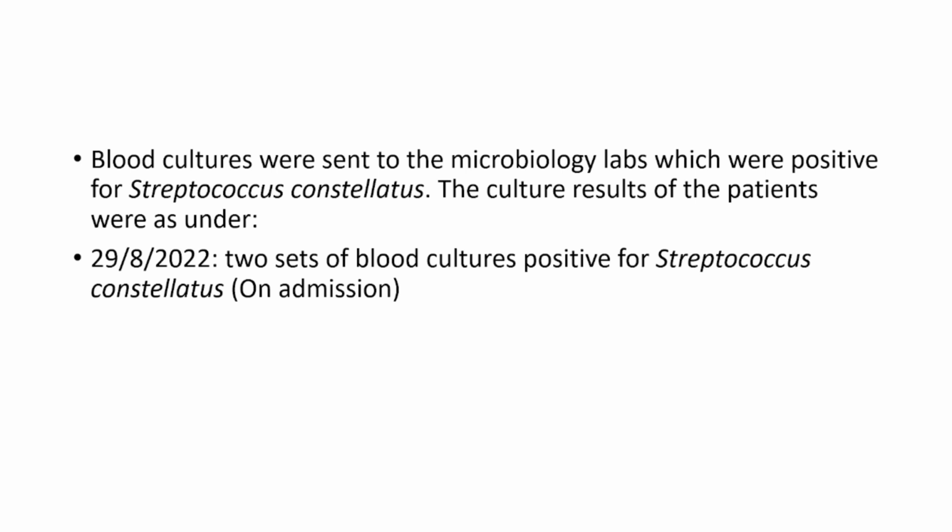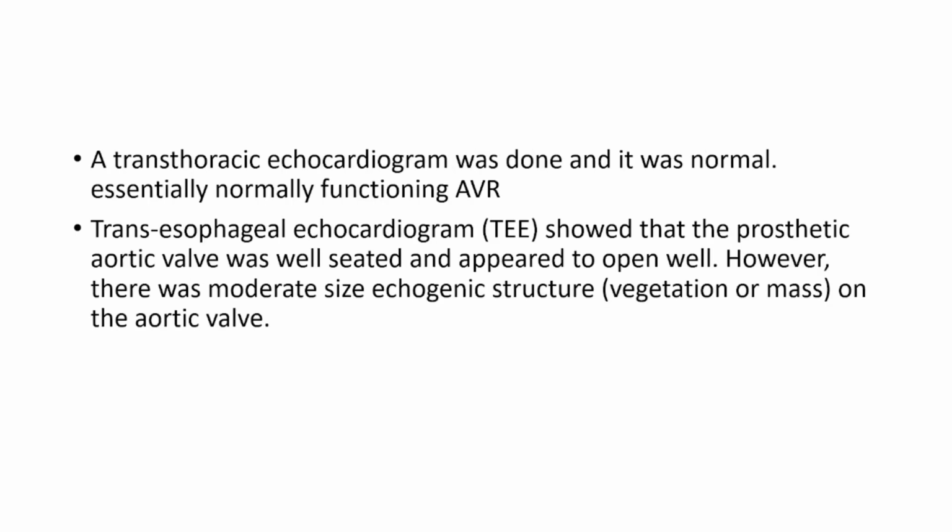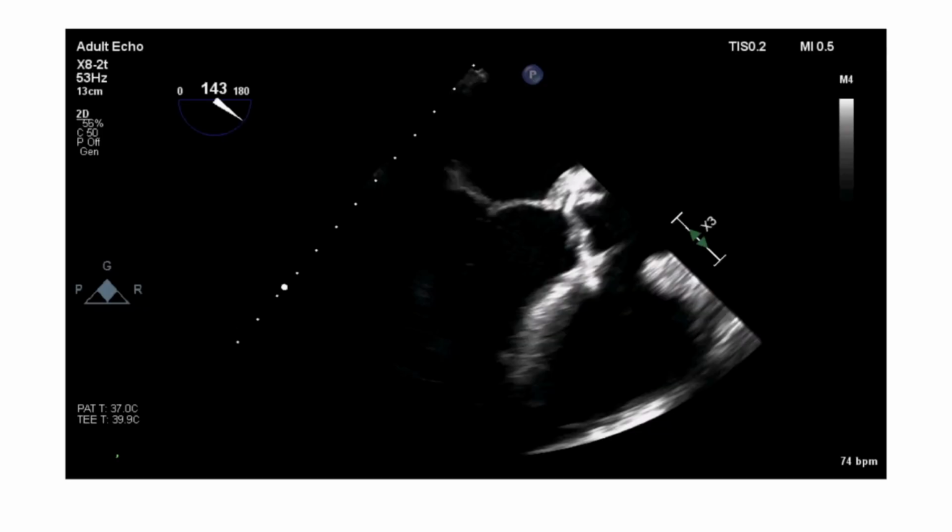Blood culture was sent for this patient, and the patient was admitted to the hospital, and his culture came back with Streptococcus constellatus, persistently in 3 cultures. And then echo was done. Echo was normal, but due to infective endocarditis, and this is a prosthetic valve, so we did a TEE for him.